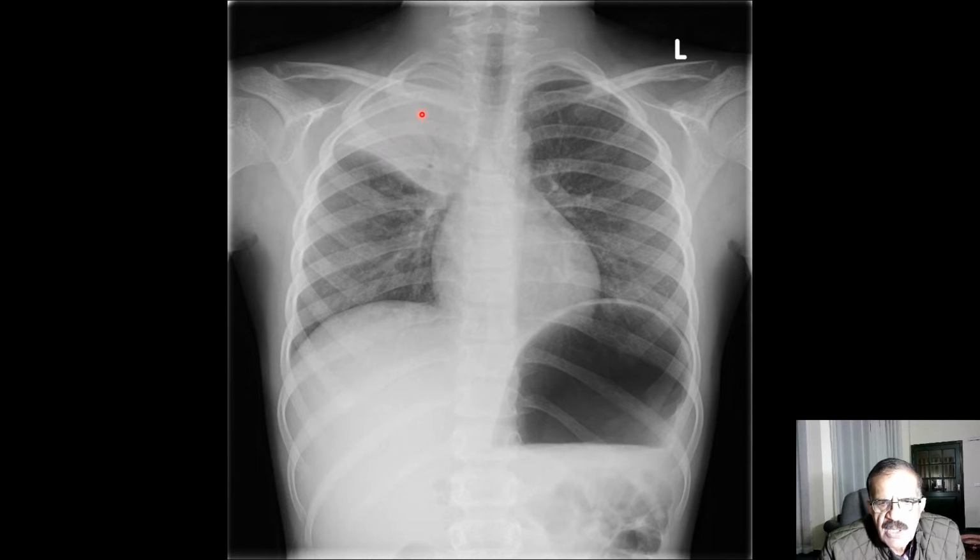In some cases there may be some volume loss, or there may be some underlying atelectasis, and that might pull the neighboring structures toward the opacity. So I think that is the reason this transverse fissure has become oblique and has also become somewhat concave toward the opacity. So this is consolidation. This is fully consolidated lung.